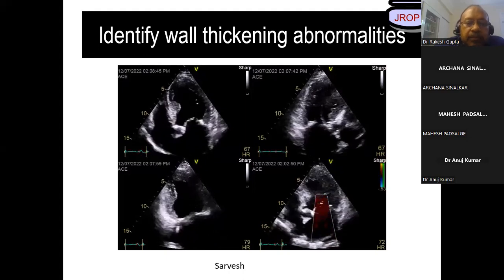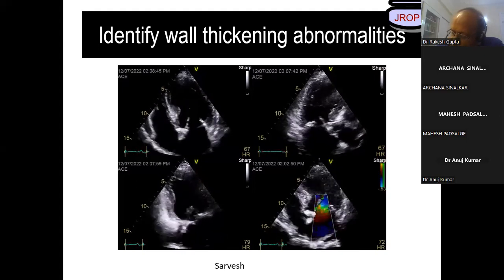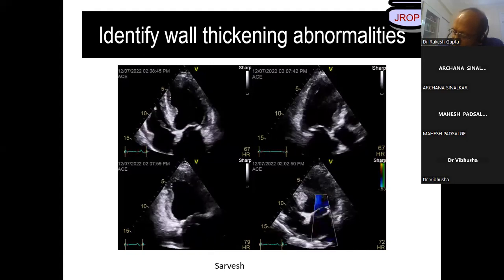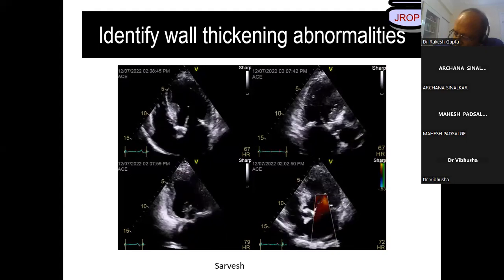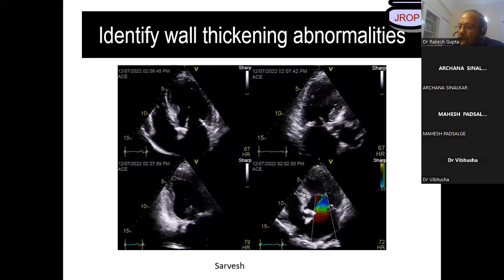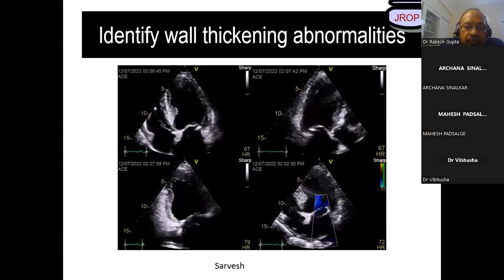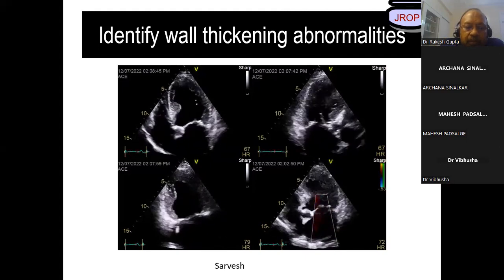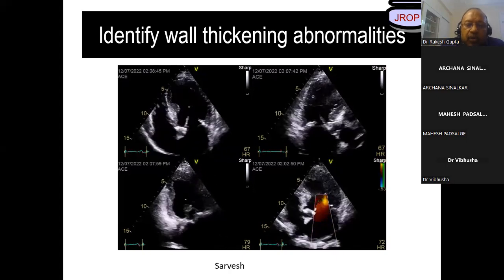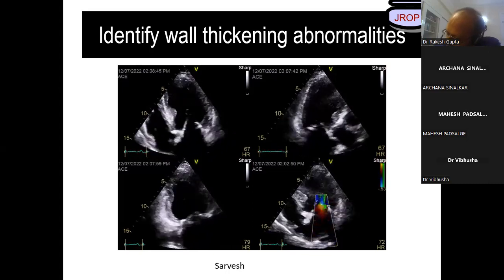All right. Now, all of you, right from Dr. Archana, Madhurima Datta is not there, Mahesh Padsalge, and I'll ask this question from Vibhusha Vishwanath, Navi Mumbai. Yes, sir. Tell me wall motion abnormality, Vibhusha. Sir, in basal septum and basal inferior. Okay. That's all? Yes, sir. No, all of you are not right. Now I'll tell you why.